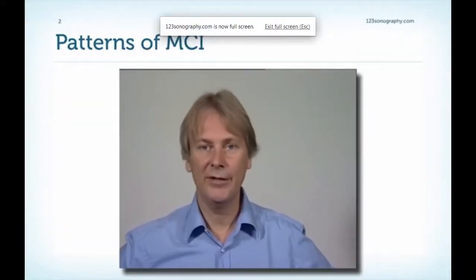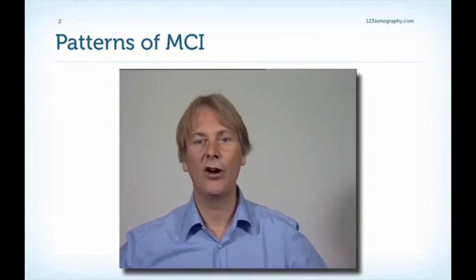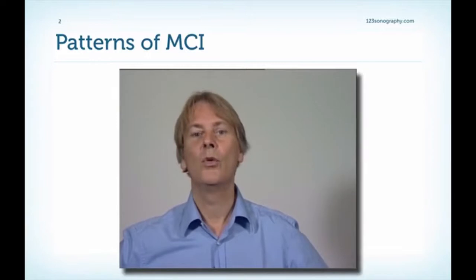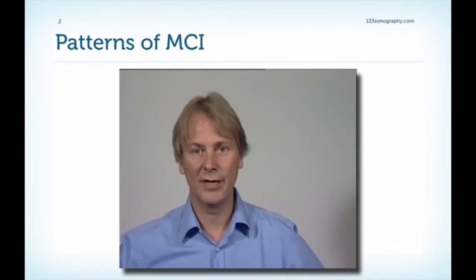When you see a lot of patients with coronary artery disease, after some time you will realize that the patterns of involvement repeat themselves over and over again. In this chapter, I want to show you some typical patterns and also which vessel territories are involved and what the importance is for remodeling, for example.